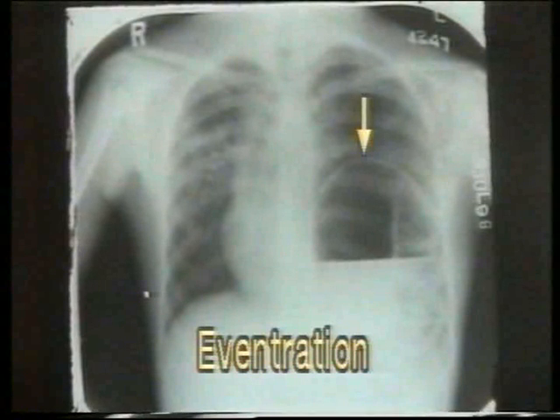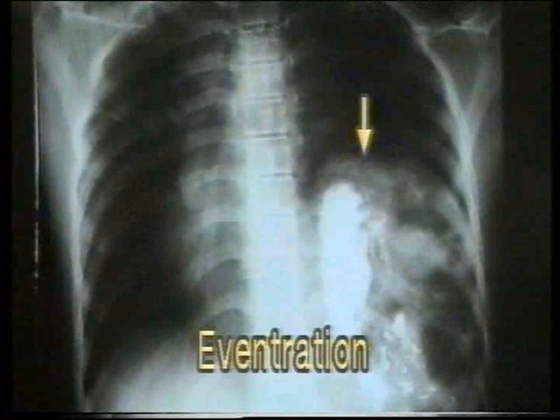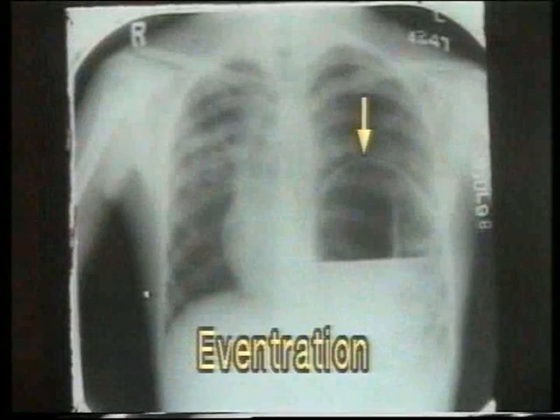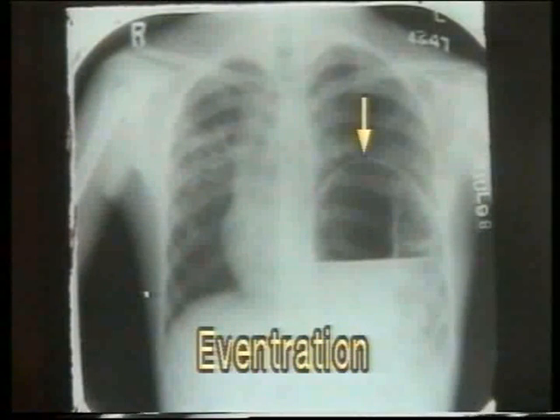This adult patient has developed tuberculous infiltration in his right lung, and the eventration of left diaphragm was an incidental finding which was initially mistaken for a lung abscess. Barium meal shows the stomach and intestines in the chest, confirming the diagnosis of eventration. Note the smoothness of the dome of the elevated diaphragm and the gas shadows and the fluid levels.